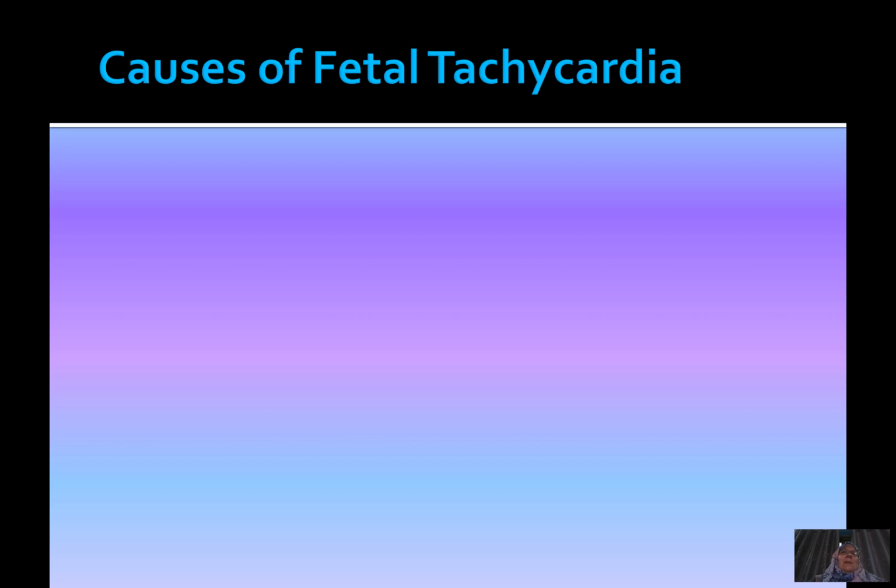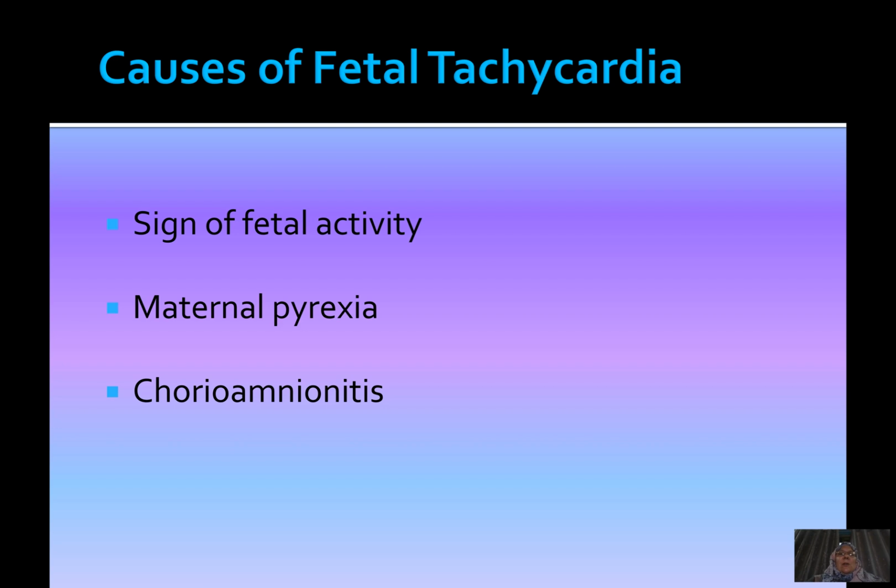So, what can be the causes of a fetal tachycardia? Write them down with your pen and paper and see if you have them right. First of all, fetal tachycardia can be an expression of fetal activity, which is of course a good sign. But fetal activity is never continuous. So if you have a fetal tachycardia, you will see that at some point it terminates.